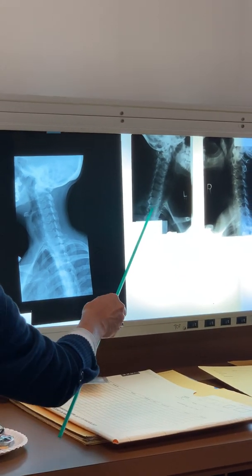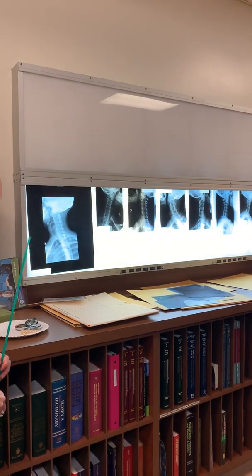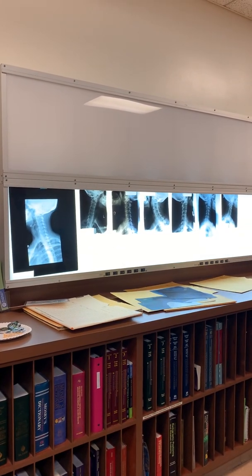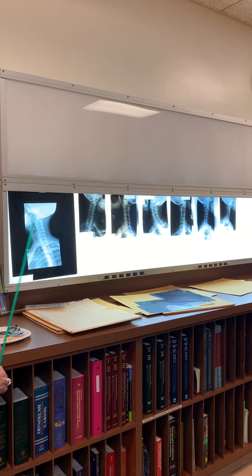All right. So it's this one. That's an LPO, opening up which intervertebral foramen? The right side, okay, which is the remote.